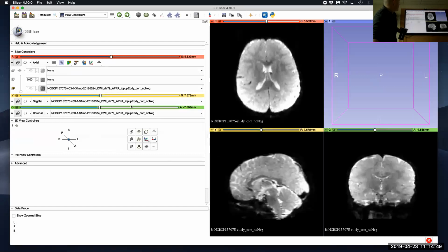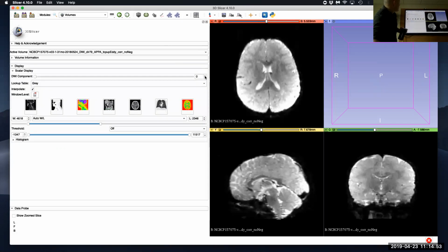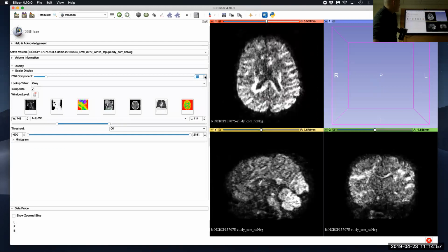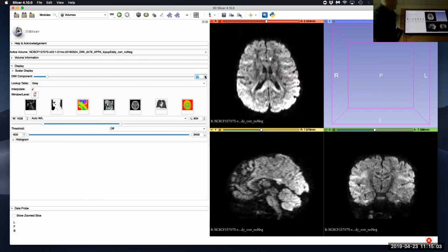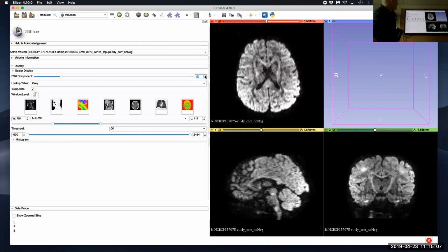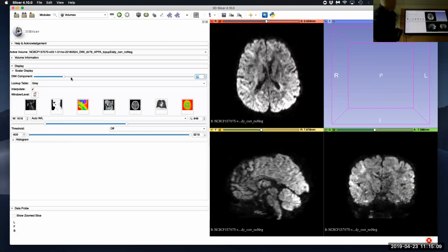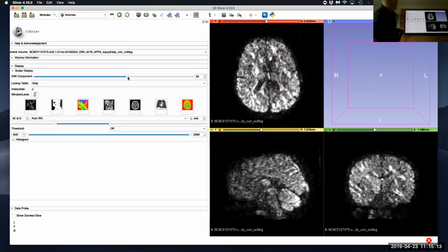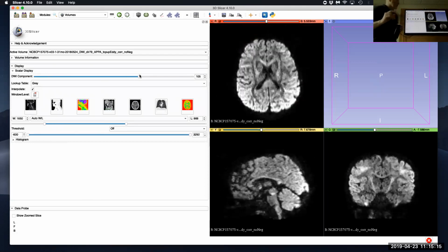and that's now a corrected image. It should have no more motion on it. The eddy current artifacts have all been removed. Now there still should be bad data on there. Actually, I know how I can find out.